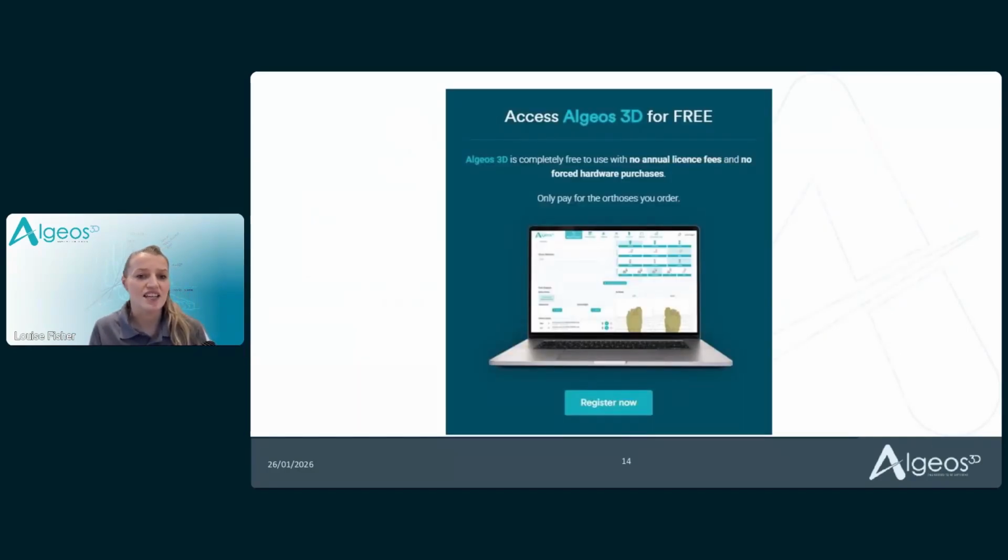And as you can see here, just a little demo of, you can access it for free. So it's simple to just log in, algeos3d.com, log in, sign up, and really start to have a play with the system. And then ultimately you buy what you use. If you decide to print a pair of custom foot orthoses, then you pay per product.